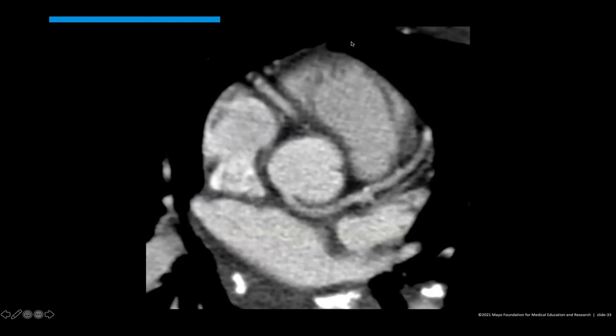If the image is zoomed out a little bit, you can use the sternum as your reference point for anterior. Now, in this case, we don't see the sternum, but we do see the medial aspect of the right upper lobe and left upper lobe.